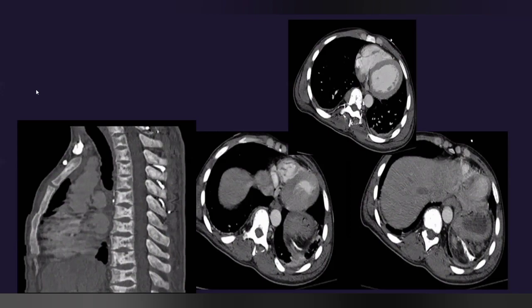Sir, there is consolidation in the left lung field, an area of consolidation. Yeah, some airspace disease, as I showed you on the X-ray. The X-ray did show acute chest syndrome, so interstitial prominence and airspace densities were there. Do you see anything else other than the lungs? Paravertebral soft tissue, bilateral paravertebral soft tissue. What could that be in this case?